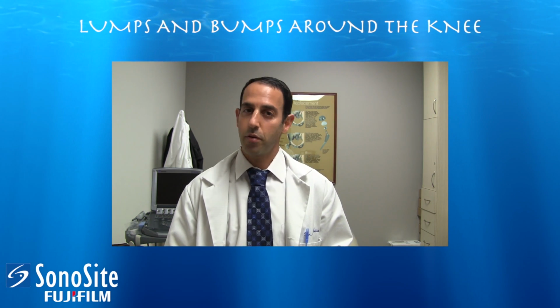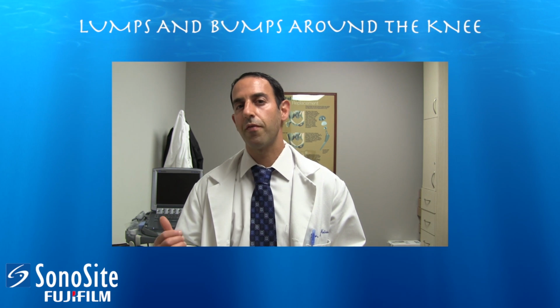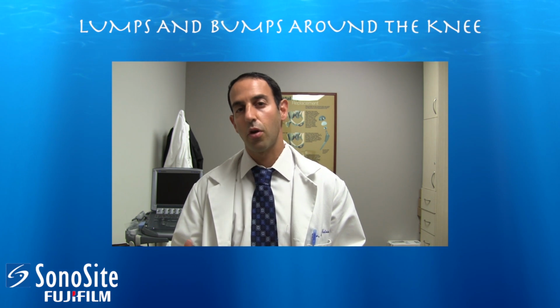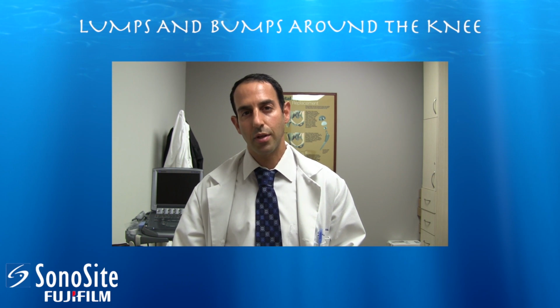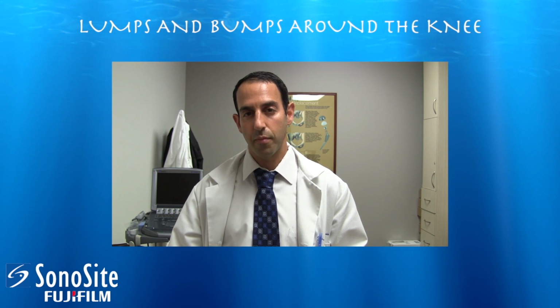I'm going to have a focus essentially on Baker's cysts because they're so common, and we're going to discuss different kinds of cysts and also different findings you may see within the cysts, such as septations, loose bodies, and multilobular cysts. Also, I'm going to discuss a ruptured Baker's cyst and findings you can see in the gastrocnemius muscle with a rupture of a Baker's cyst.